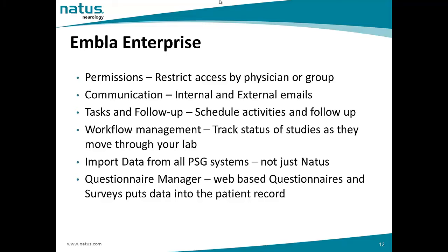So let's say, for example, this customer has a system from brand X, and she wants to keep all the clinical outcomes in Enterprise. We can do that. Let's say this PSG system has 3 different kinds of reports: the diagnostic, split night, and titration. We will have to customize 3 IntelliSense modules, one for each report, in order for Enterprise to scan and create this data in the database.